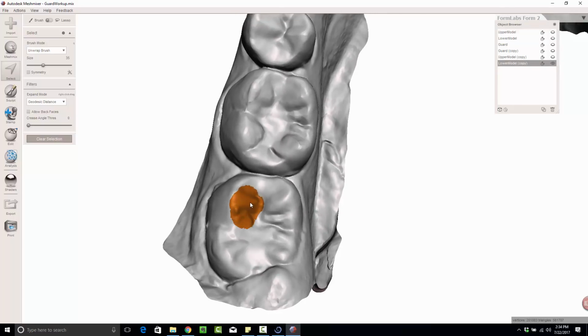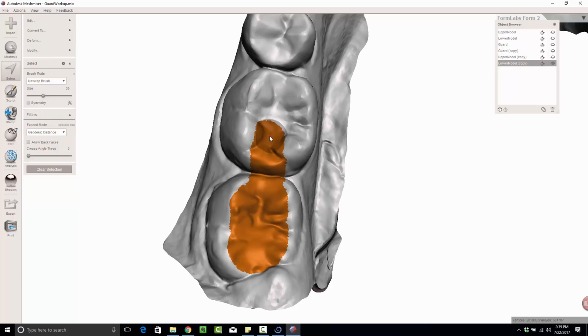This is going to work pretty well in this. And I'm going to highlight inside the cusp tips. It might lap over them just a touch, but I'm not really trying to. I'm trying to stay right inside of them. Fill that, and then come right over here to the next tooth, bridging that gap just slightly across the marginal ridges. And here we go.